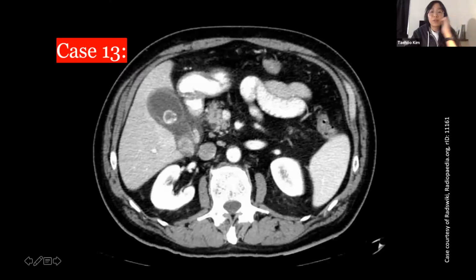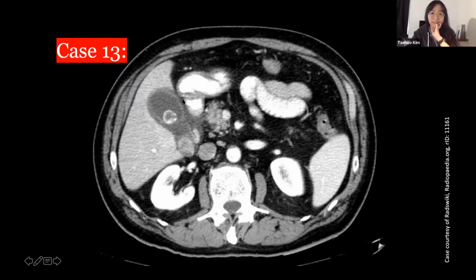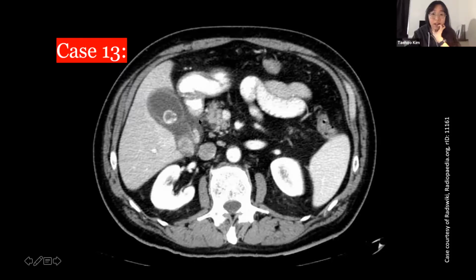Patient presents with right upper quadrant pain. Do you see anything? There's some small bowel fat stranding near the liver. Here? Yeah. Yeah, good job. And yeah, so very good. You caught the fat stranding.